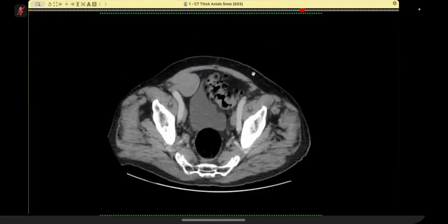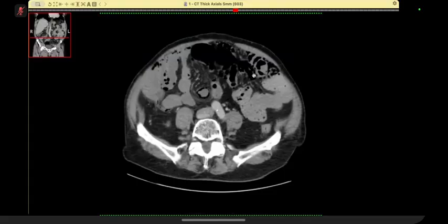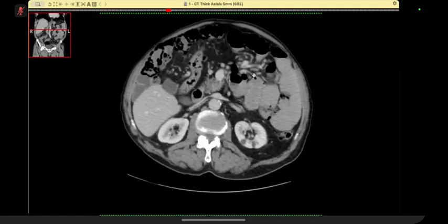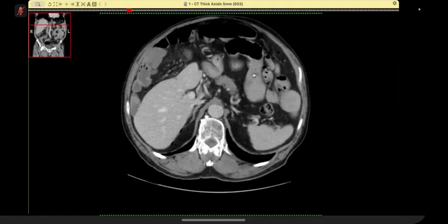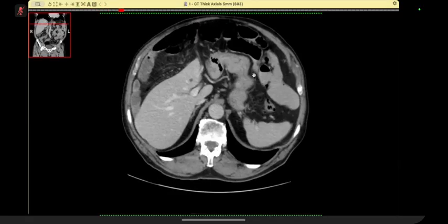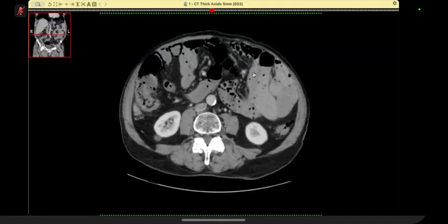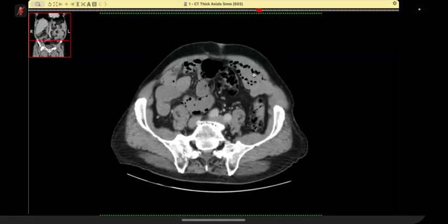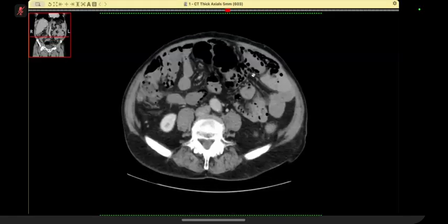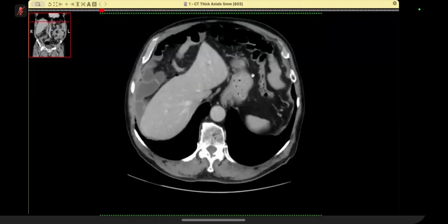So what is your conclusion? Sir, keeping in view these imaging findings, I'm thinking that the patient has pneumoperitoneum likely secondary to rupture of the cystic lucencies noted in the sigmoid colon and the ascending colon. I can also see that there is pneumatosis intestinalis in this patient, and these are usually benign. This is pneumatosis coli, which is usually of benign etiology, but if ruptured, it can cause air within the bowel wall and can also cause pneumoperitoneum.